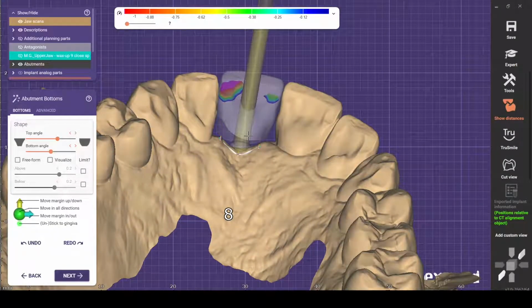This is a quick follow-on video showing how to bring in an extra jaw scan based on a pre-op so that your pre-planning can incorporate right into your manufacturing of the provisional.